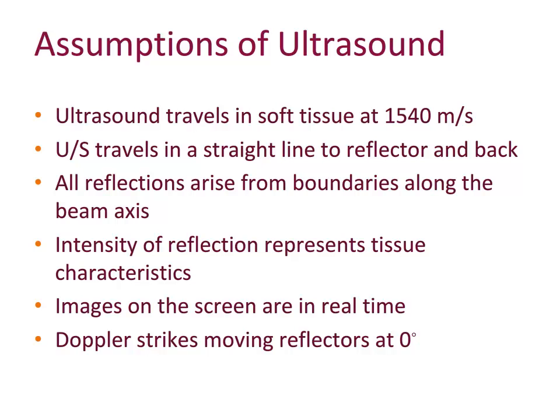And in the case of Doppler, the assumption here is that the moving structure is at 0 degrees with the beam. Of course, there is no realization of time gain compensation before the images are processed, and the temporal resolution is assumed to be perfect by the machine and that images are generated without any lag. You can see how all of this can result in some usual misunderstanding between the user and the images generated.